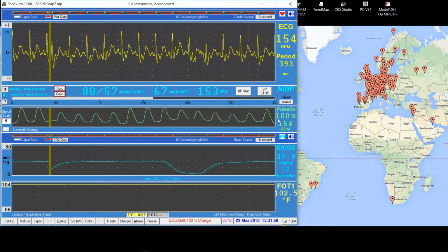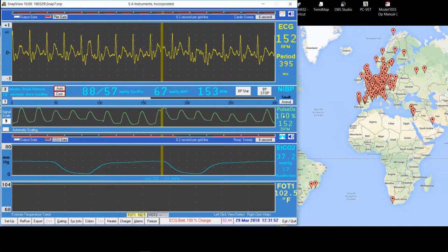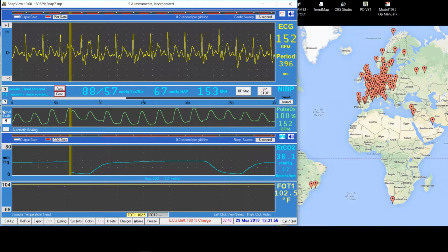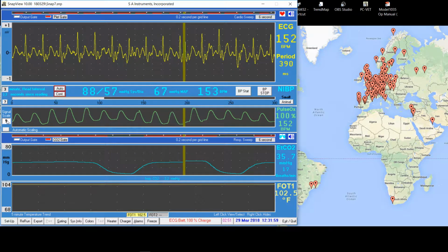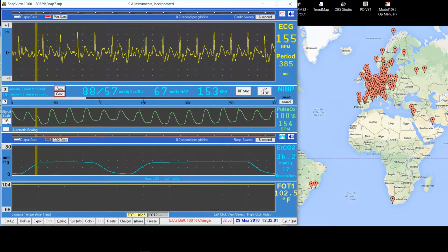Both heart rate and oxygen saturation are calculated and displayed. On the left side of the waveform, signal scale is displayed. The number gives a measure of the strength of the pulse oximetry signal. Weak signals will be 5 or less, strong signals 10 or more.